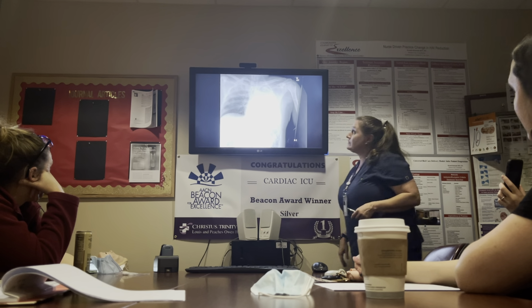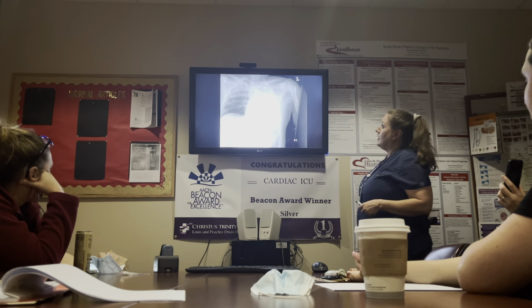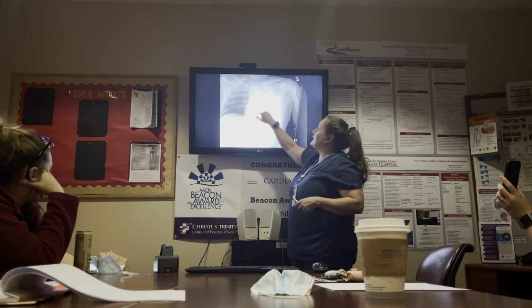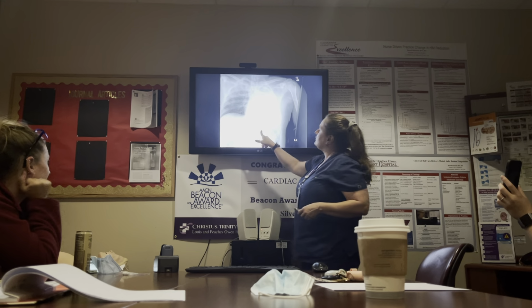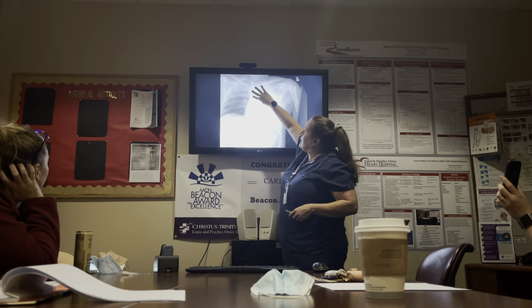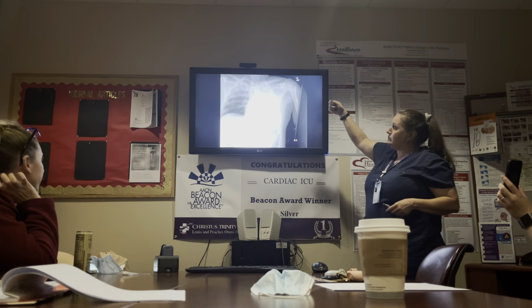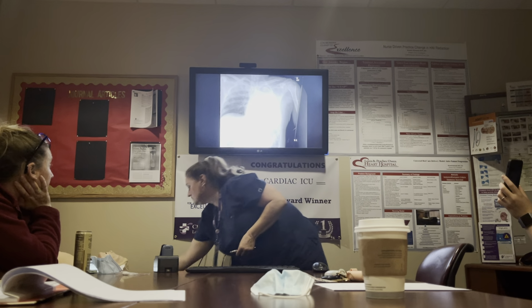This is what happens if it stays right main stem for very long. You can see there's some air bronchograms, and I know it's hard to see, guys. I apologize. They've got a feeding tube down here. But this endotracheal tube, there's the carina right there. That endotracheal tube's at least 2 or 3 centimeters down. So that has to be retracted, and we probably have to suction to re-expand the lung.